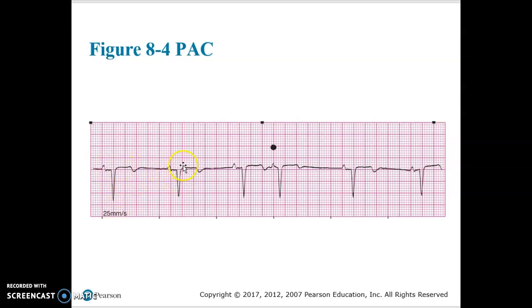PQRST, PQRST. We do see that this strip, we do see here that this is, we got some length here. The pulse rate is 60. But do you see what's happening here? We have an early beat.